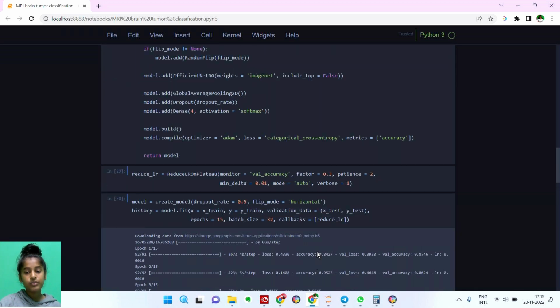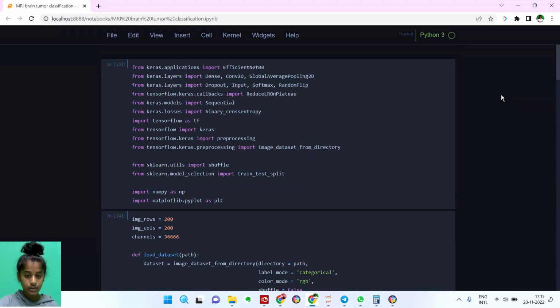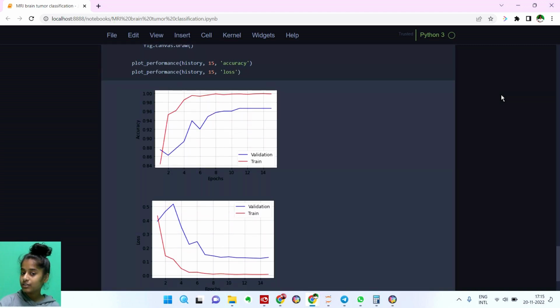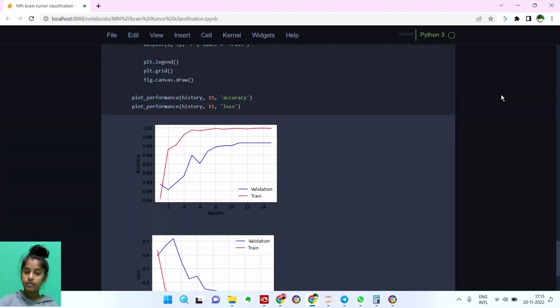So yes, we can see that we've got our brain tumor project done and it has come out pretty good.